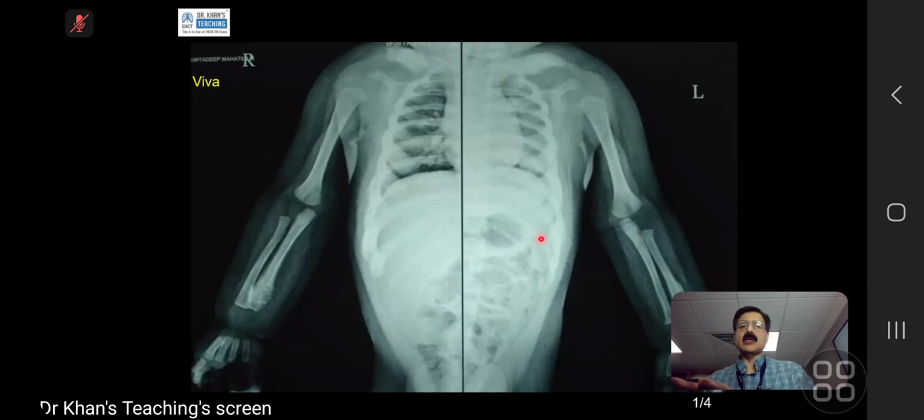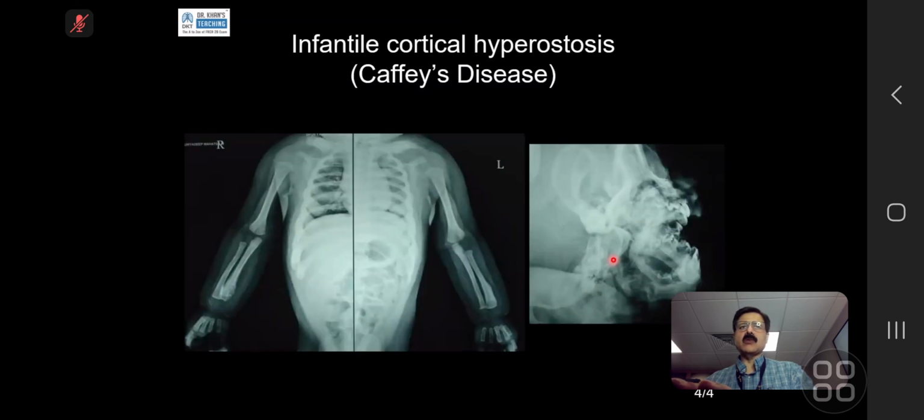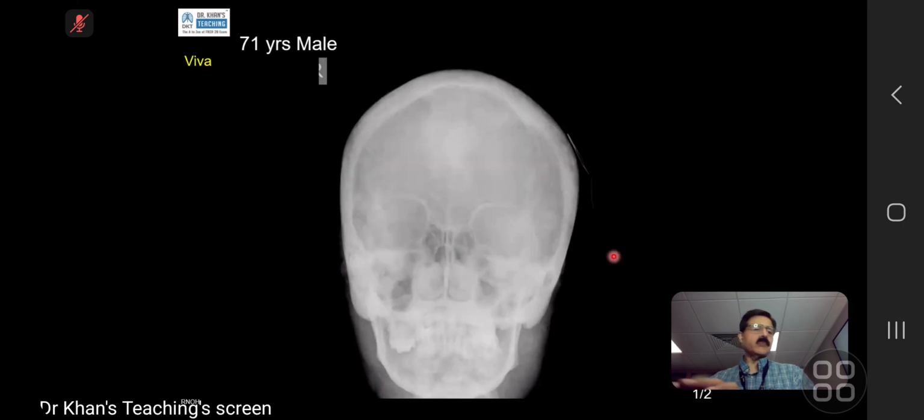You will tell the examiner, I want to see the mandible. If the examiner has got the mandible, they will show you. Look at this case. Now, these are the teeth. Actually, where I'm pointing out is the mandible, and everything here is new bone formation. So, a very, very thick mandible. So you have to ask the examiner for it.